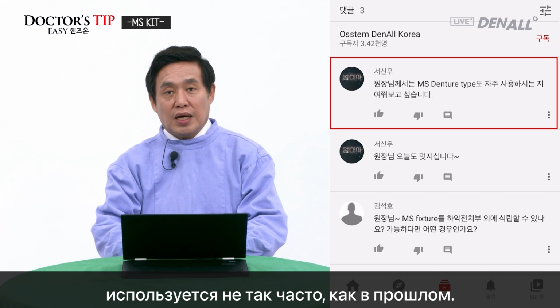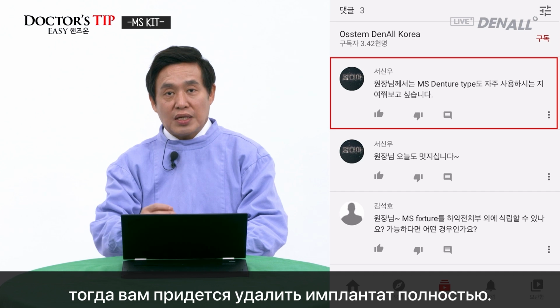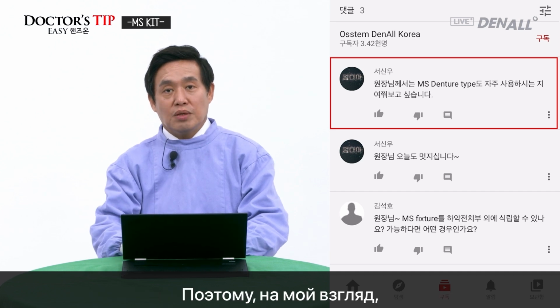And also the MS implant denture type is a one body system. Just in case the upper part, if the head is ruined, then you have to remove the fixture.